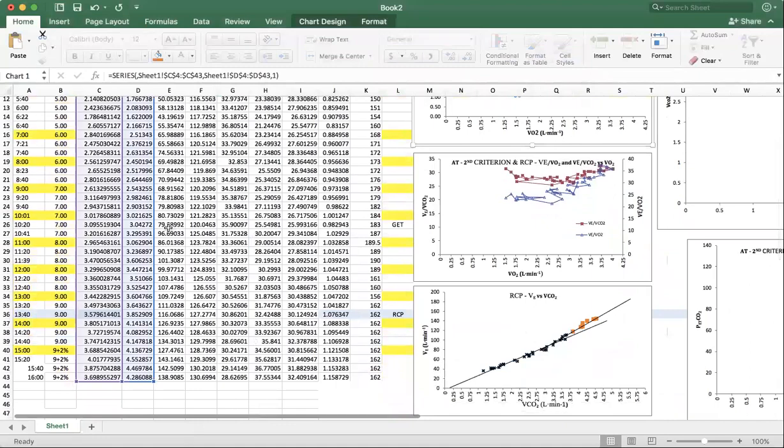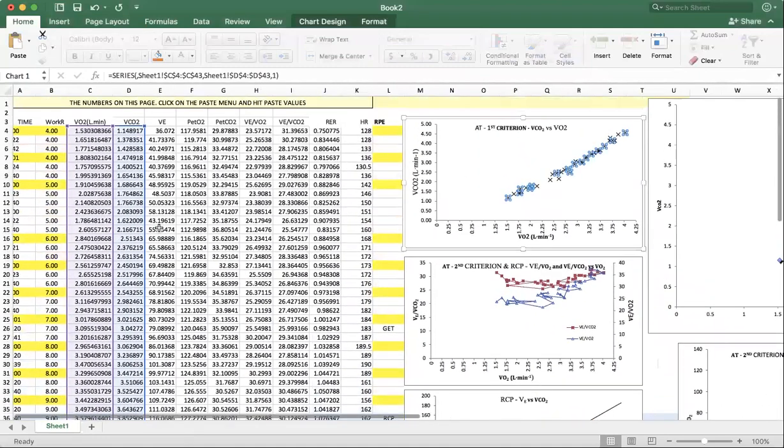Now you're going to see these two highlighted boxes that are showing where the data from that graph is being generated from. You'll notice that the boxes at the top and the bottom have these selection squares, and you can see how my cursor changes when I float over the selection square. This will allow you to adjust which data points you've included within your graph.